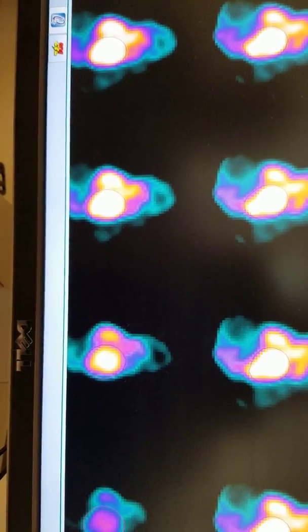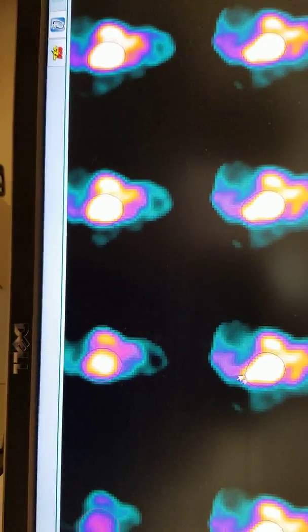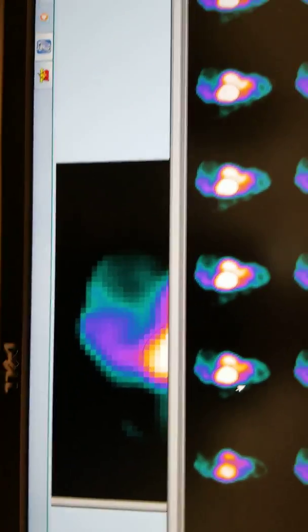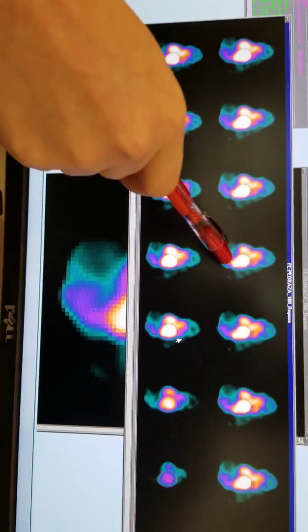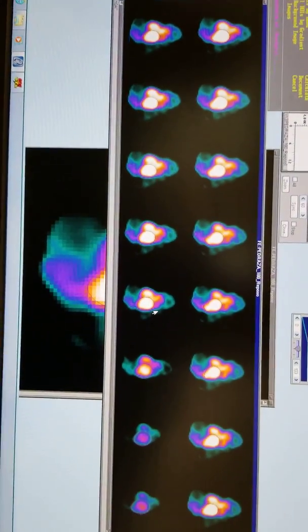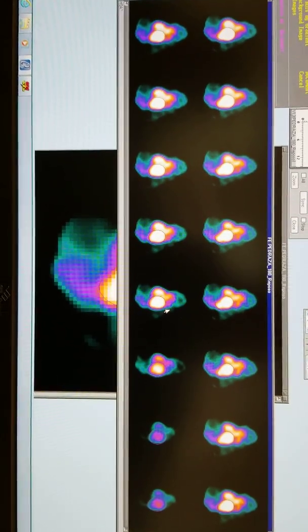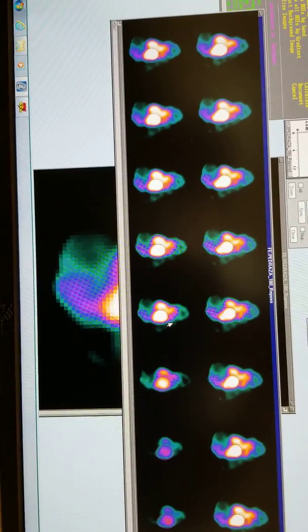For grading purposes, just for today, this one appears to be my very worst frame. I'm missing a good chunk off the tail. So adjust the size so that I can count. That is 1, 2, 3, 4, 5, 6. So it's 6, right? So it's the 6th image that I want to change. However, remember our images start from 0 and they go to 15. So if I want to change the 6th image, I'm actually going to input the 5th frame.